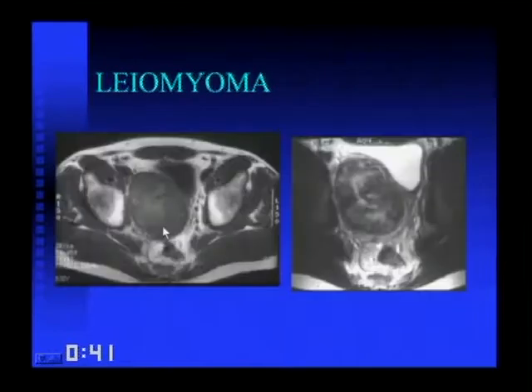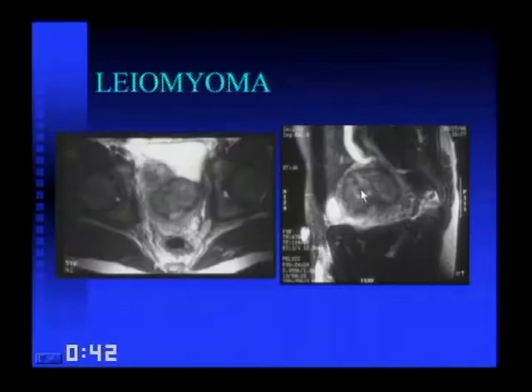And here's another one that didn't look characteristic. It was a big tumor that was involving the prostate, the seminal vesicles, but very unusual signal. It's heterogeneous on both T1 and T2 scans. This turned out to be a leiomyoma at surgery. Here's other levels. Here you can see lower down where it is invading the prostate. And here on a sagittal scan, you can see the hydroureter that was caused by mass effect from this tumor.